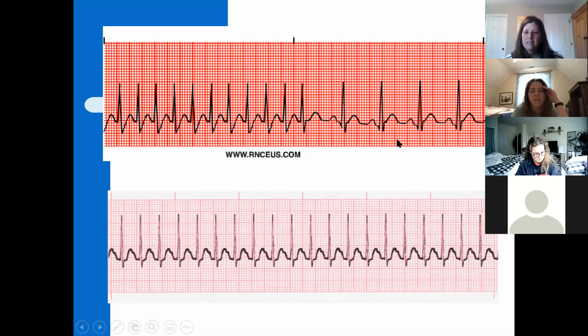Oh, yes, I'm sorry, I said that wrong. Thank you. Whew, maybe I should drink more coffee. Yes, you're exactly right, I said that incorrectly. You take a 6-second strip times 10, but we don't have the same rhythm in a full 6-second strip, so it's really hard to calculate out and say for sure.